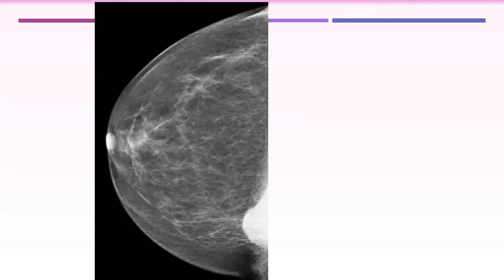So we have to do ultrasound. We don't expect these lesions, or we can look for the MLO view. If it is a mass, it might be visualized, but if it is not seen, still it could be a mass, because we said a lesion in the extreme medial breast might be out of the field on the MLO view. And the sternalis muscle is usually not visualized on the MLO view.